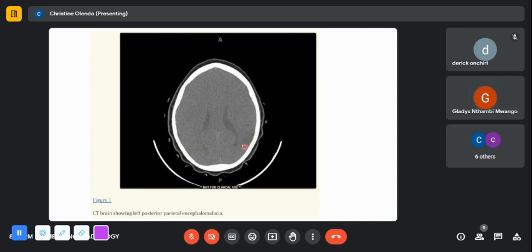Also, the volume loss will cause the structures to be pulled towards it. There's volume loss because of gliosis. So there was an old stroke there, an old infarct that healed with gliosis, and what you're just seeing is hypoattenuation. If it proceeds, it can even give you a cyst formation. But even where you have encephalomalacia, there is loss of volume because there is brain injury, parenchymal damage.